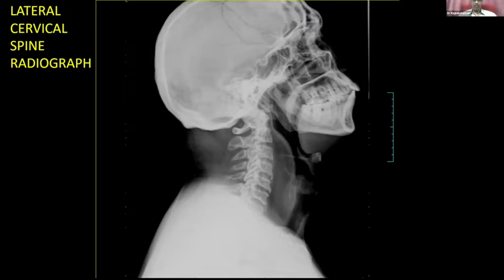So looking at that image, how will you say roughly there is a widening of the prevertebral soft tissue? Is there any other set of landmarks or reference points? Mostly on X-rays, unlike a CT, where we can measure it with a cursor, on an X-ray film we cannot measure it.